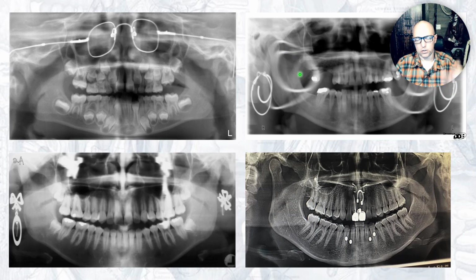But it's larger, it's stretched out horizontally. This is really stretched out. It's projected way up here. Nice earrings, not so nice for my diagnostic capability. Overlapping sinuses, overlapping the teeth here. In some cases, patients say they just won't remove things. Not sure, it looks like lip studs rather than tongue studs. You'll see tongue rings, tongue studs, nose rings.